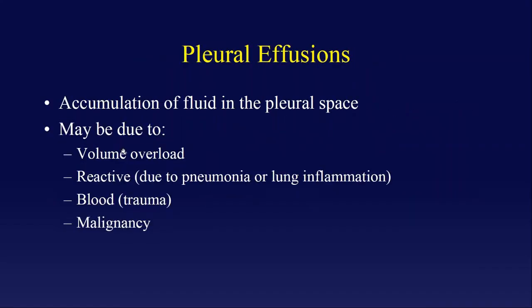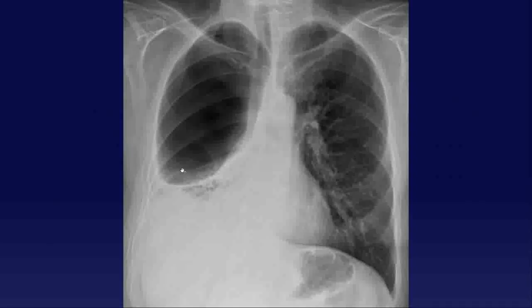I'll never forget, see if we have a tension pneumothorax here. I came in one morning and the patient's heart was over here. Their entire mediastinum was almost shifted over. It was one of the worst tension pneumothoraces I'd seen in my life. I'm trying to get a hold of the team to tell them this guy's got a huge tension pneumothorax, and it took me a while. They finally called back and said, sorry it took us a while, we're trying to convince this guy to let us put a chest tube in.